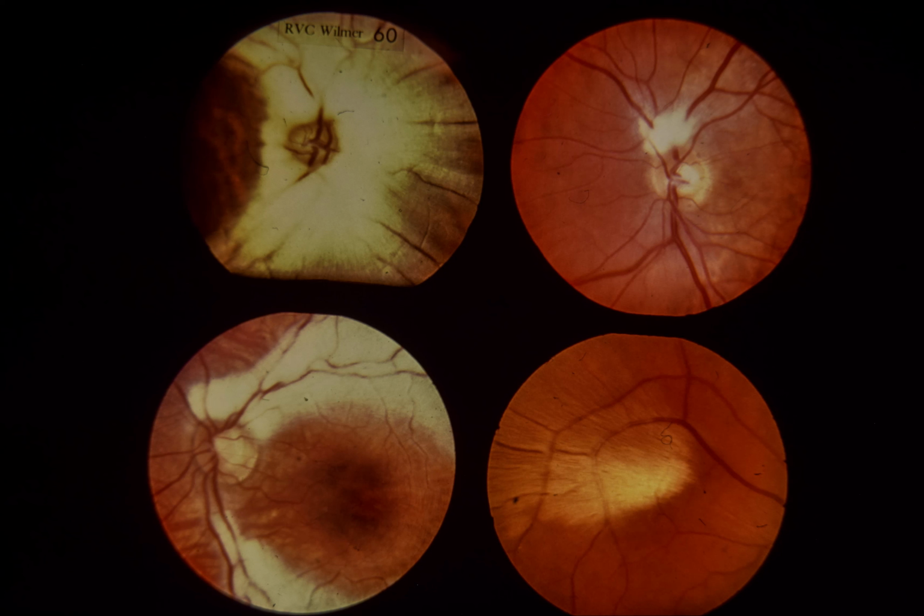Slide 60. Patterns of retinal nerve fiber myelination. This slide shows patterns of intraocular myelination in 4 patients. Upper left. A common pattern is that of extensive myelination that begins at the optic disc and extends peripherally in all directions. Upper right, small patches of peripapillary nerve fiber myelination may also be seen.